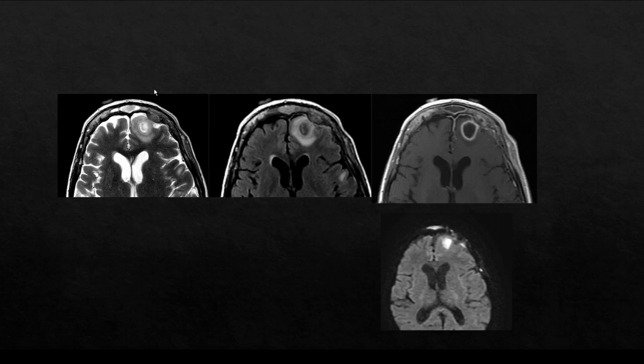We have another different patient with frontal sinus disease and a mass within the frontal lobe. Now this mass is not a tumor, as we'll discuss.